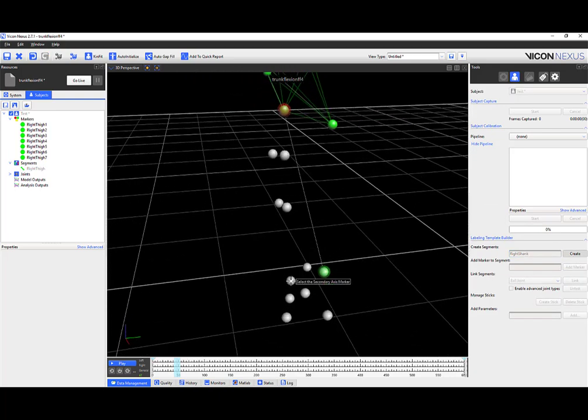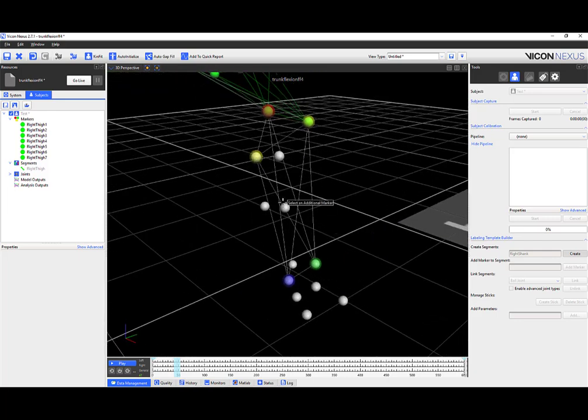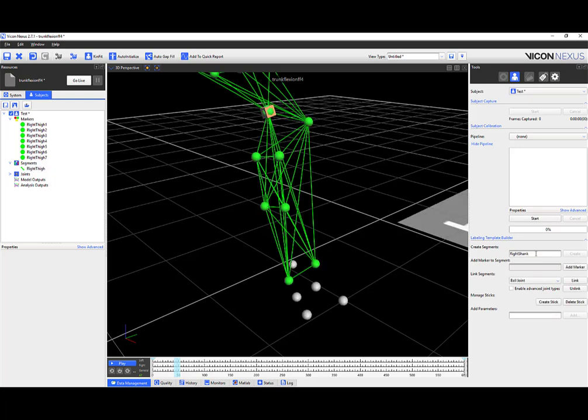I should have selected this guy right here, the lateral and medial malleolus of the ankle. Right, once I have my joints, I'm going to go ahead and hit the clusters. Cool. Right, moving on to the foot.